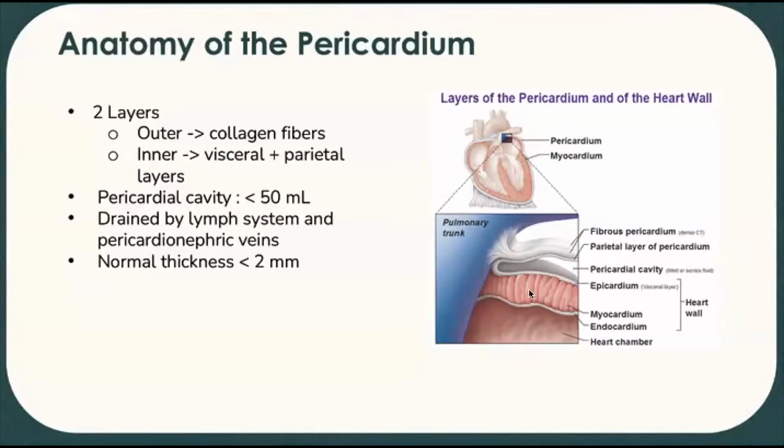The visceral layer covers the epicardium, where there's a variable amount of fat that we can often see on echo as well. And the thinnest segments of the pericardium I found ranged between 0.7 to 1.2 millimeters. That was with measuring by CT, and 1.2 to 1.7 when measured by CMR. The discrepancy, I think, can at least partially be explained by including small amounts of physiologic pericardial fluid in the measured thickness itself.